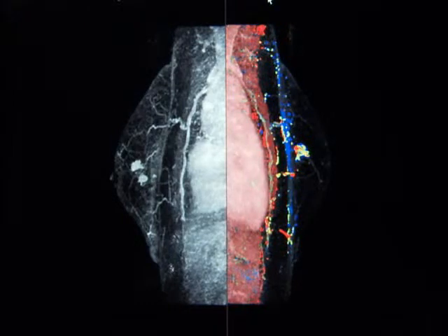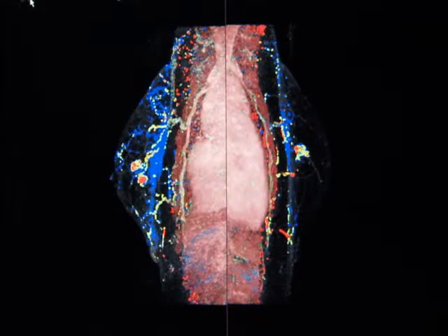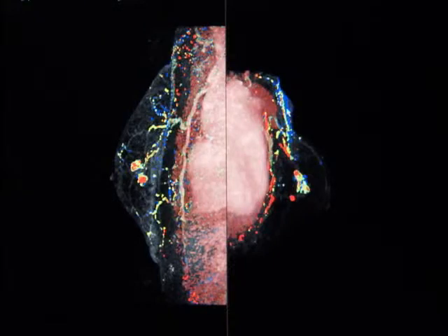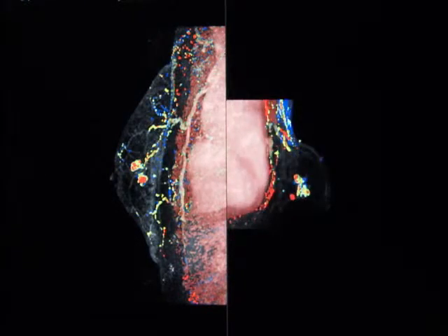This allows you, again, your very first pull down, you get an overview of what's going on in the breast. You can obviously see there are abnormalities bilaterally within this breast that are very concerning. Applying color parametric mapping demonstrates high threshold degrees of enhancement in both of these areas. You can see there is some noise occurring here, which when you rotate is from a little bit of motion artifact in the sternal region.